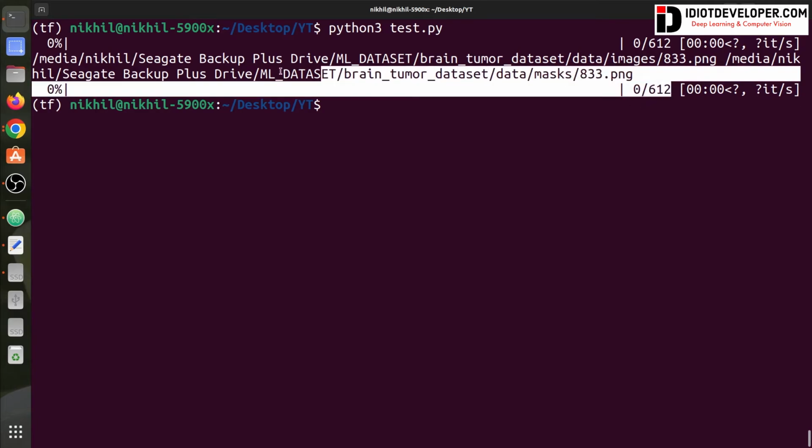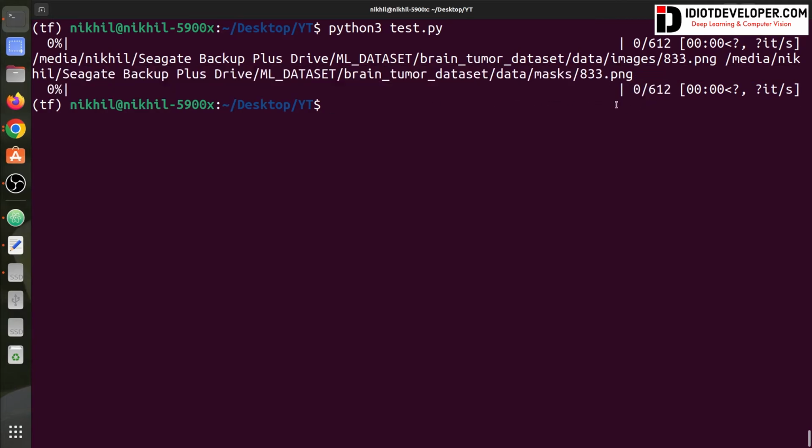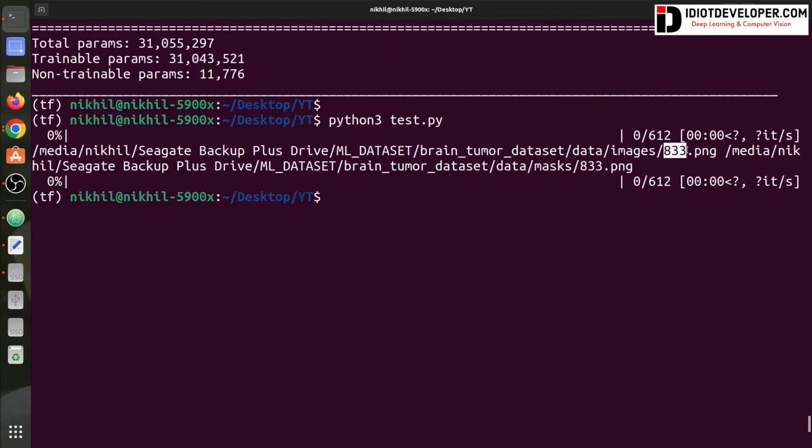And if you see this progress bar, it just stops at the 0th iteration. It does not begin from here, so it would begin something like this in order to be completed. Let's move back to our code. Okay, one thing, from this path we need to extract this name and extension also.